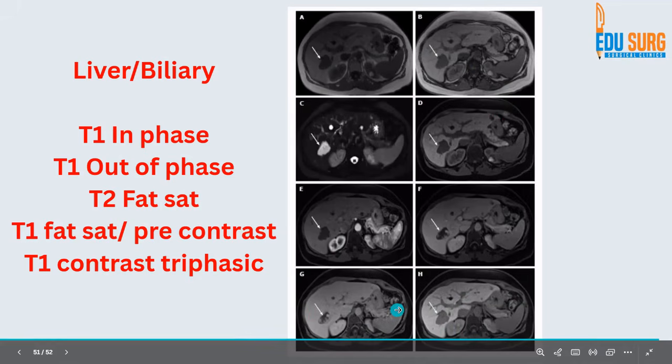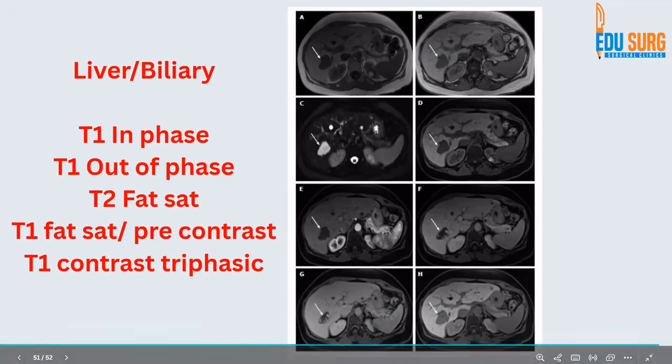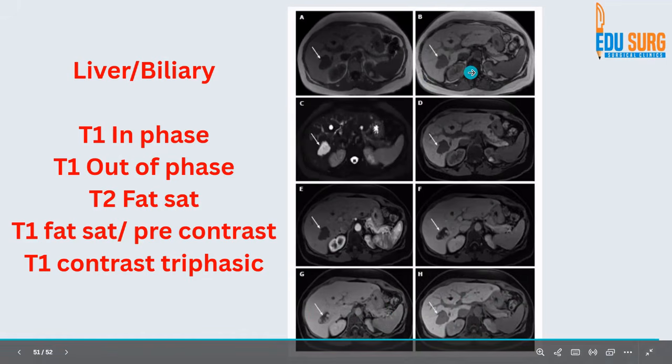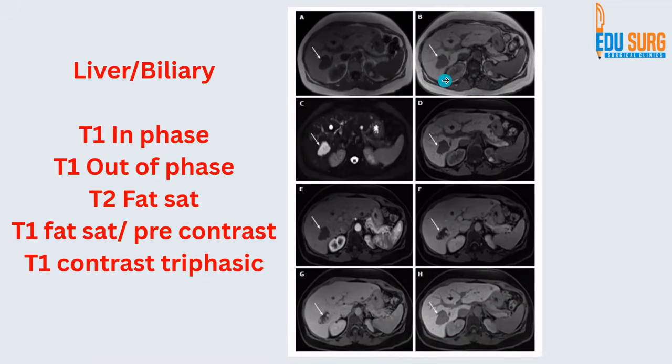So now with this series and 20-30 minutes of what we have discussed across two videos, you can at least identify these 8 slices of MRI. If you practice more, you will learn to identify lesions. You will learn to identify concepts of MRI. Look at the fat. If you can't see the fat, it's a fat saturated image. Usual trick is if it's a contrast MRI, the slide before contrast is a pre-contrast image, which is a T1 fat sat image. Okay.